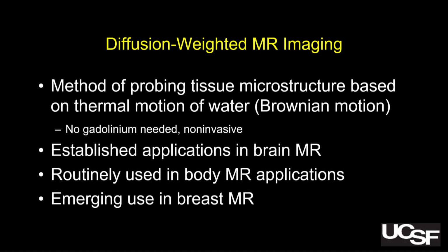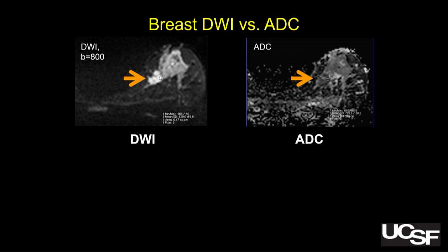And believe me, I'm working with the vendors and trying to even get within our own system, because I'm a multi-vendor place, to get all the diffusions to look good enough that my clinical radiologists are willing to look at them. So just a reminder, on DWI cancers, tumors are bright.